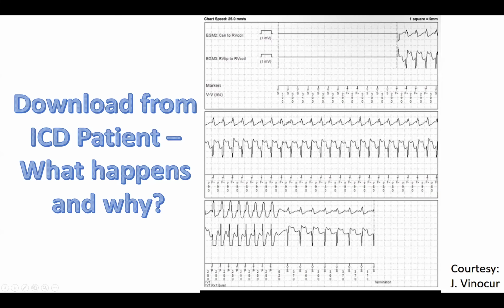What stands out to me is the bottom box. The QRS morphology of both leads looks distinctly different, and the QRS complex is also wider.